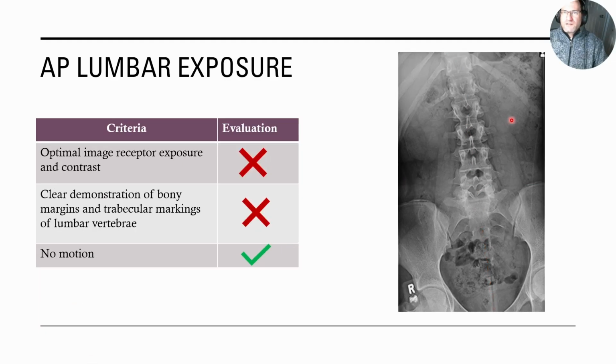Our exposure factors, if you're looking, there's a lot going on here. And I think that our exposure may be pretty close. We can see everything that we need to see in this anatomy right here. But it might be a little too extreme. It's starting to wash out some of our transverse processes in here a little bit. So I put that it really wasn't met.